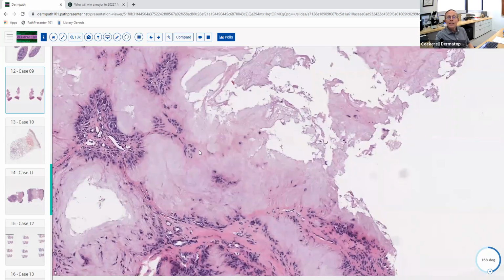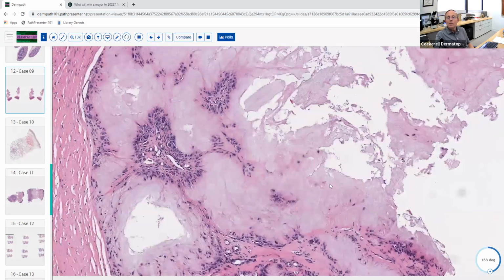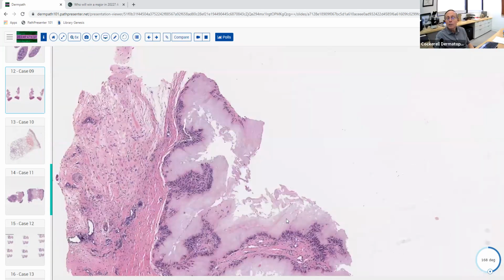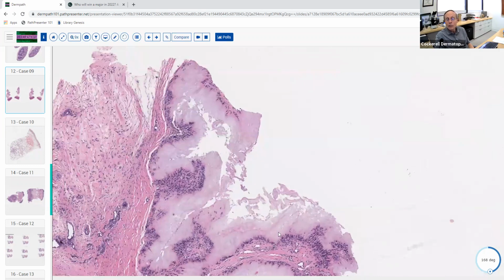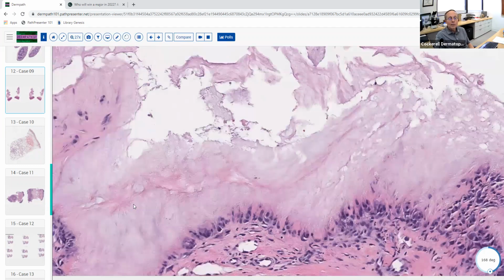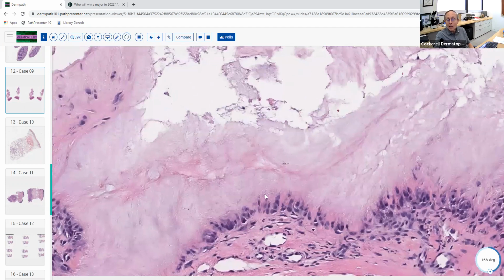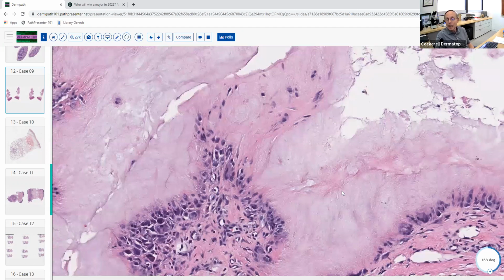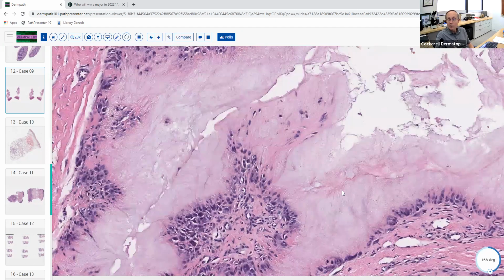So you'll have to face that question probably, because they're going to show something like this. They're going to show some granulomatous inflammation like this, and they're going to expect you to recognize the gout crystals. So you don't need a special stain for this. It's basically just like you said, you see these needle-like clefts in here that indicate that there was gout material in here once upon a time. If you polarize this right now, you wouldn't see anything because the gout crystal's been washed out in the processing of the tissue. If you were to take this tissue and put it into 100% alcohol and then make a slide out of it, you could polarize it at that point.